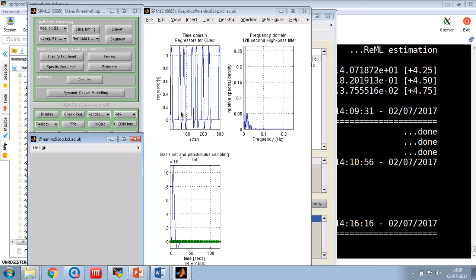Big gaps, so that's a relatively low frequency. You can see there's basically these ones that are very close together. So that's probably this one, which is higher frequency information, this first peak. Then there's some conditions that are a little bit further apart, like here and here, they're the second peak probably. And then you have these conditions where there's periods where there's a very big gap between repetitions. That's the third peak, which is actually being filtered.